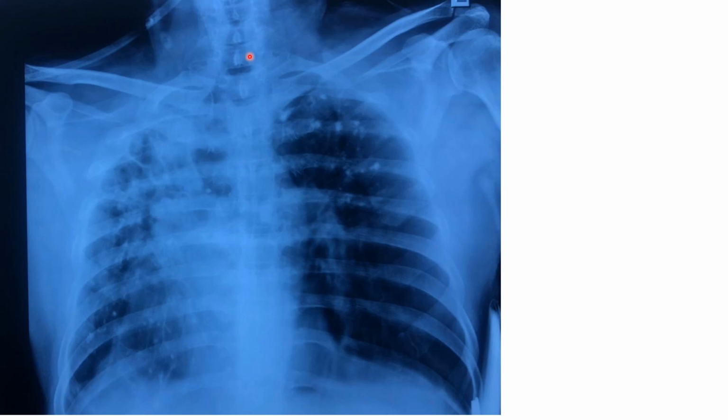So fibrosis will pull the trachea, pull the mediastinum, and there will also be a scoliosis of the spine. There will be a curvature of the spine where both the lower part and the upper part will be pulled towards that fibrotic side, and this looks like a bow sort of thing. While you examine the patient, actually there will be drooping of the shoulder, volume loss on the side, and all these features.